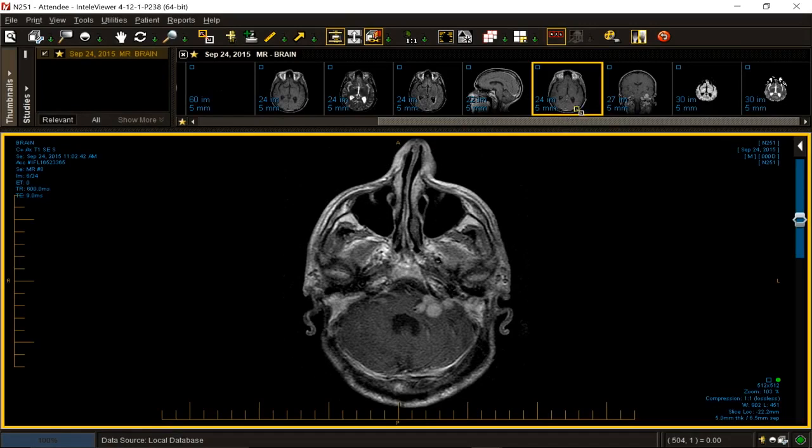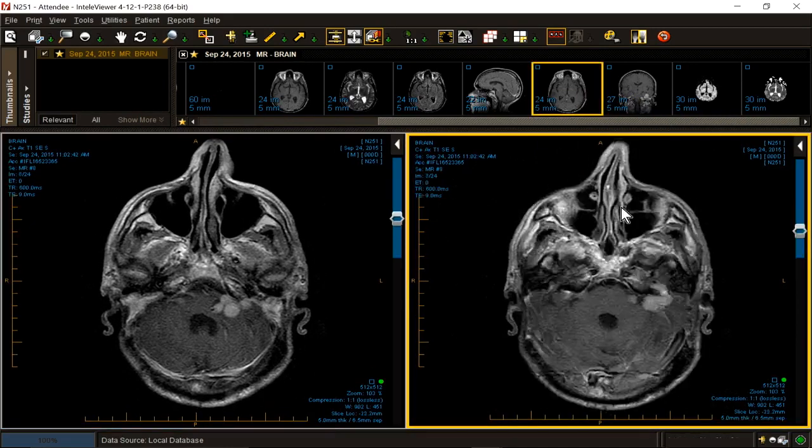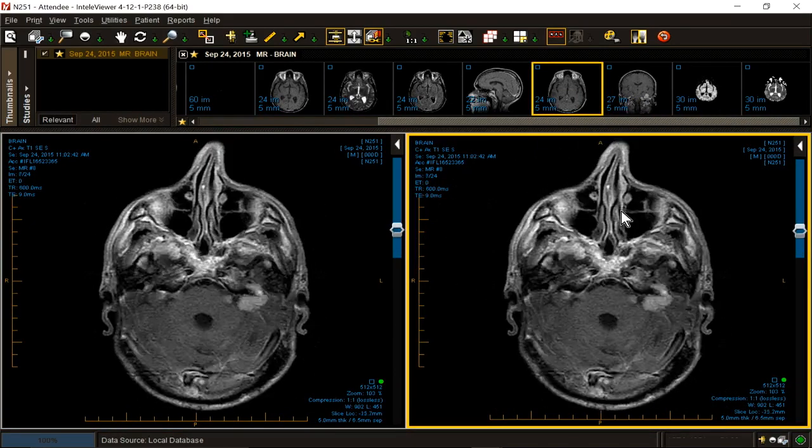Deafness, surgery, in a man, age 55. It is low field, but that's okay. I haven't shown you too many low field, mostly 3T and 1.5T. There's a lot going on here.